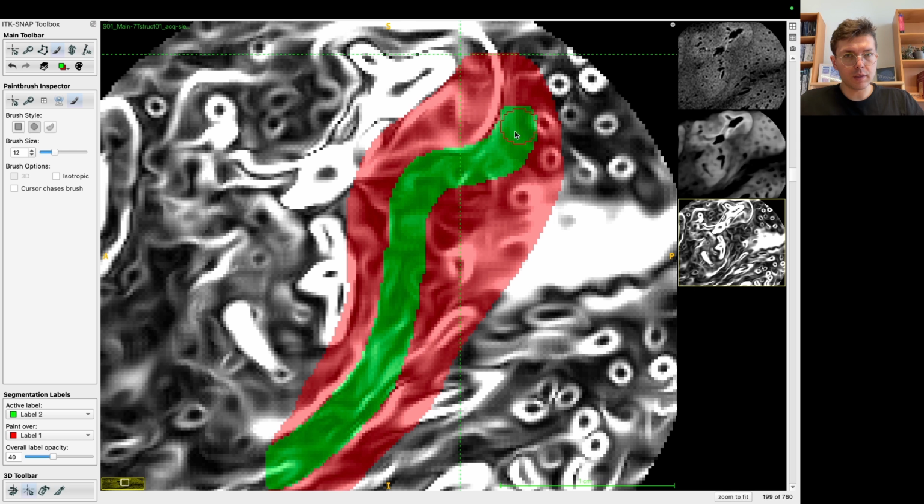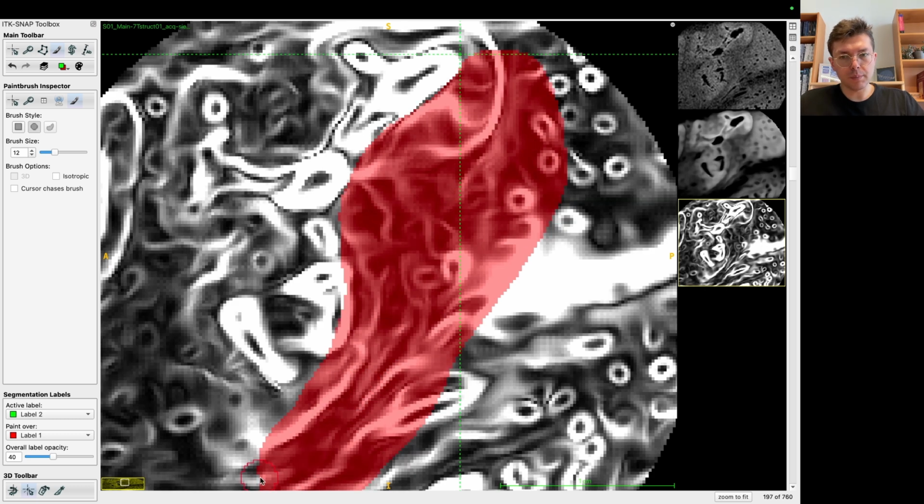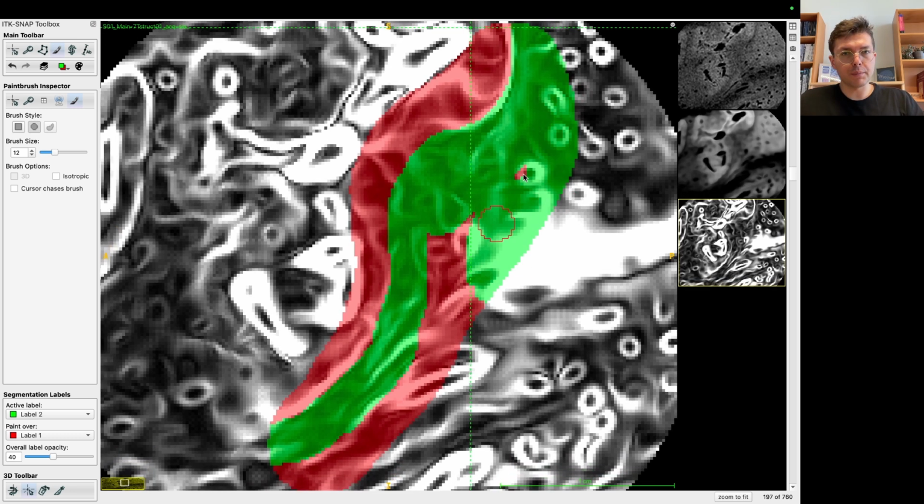Yeah, this is really hard, for instance here, but only that part you see. And I think that's actually where the A1 is. It follows with the other literature. I'm not making it up based on this data. We have other types of histology images as well to support this judgment. So this is not at all just looking at the data and making up something that fits what I'm seeing in the data. No.